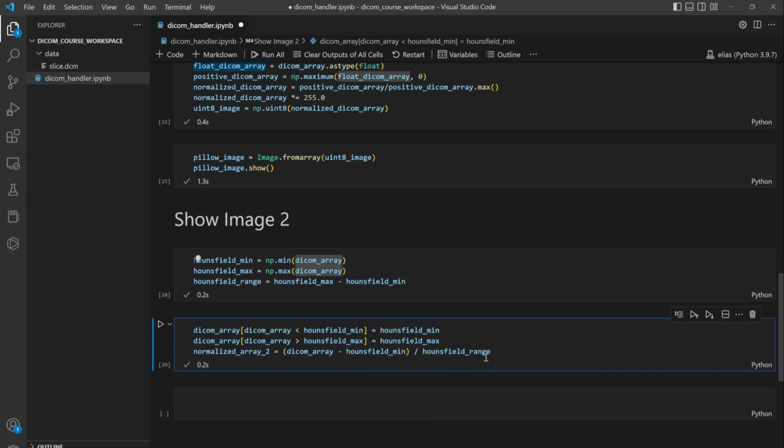So this is almost the same that we did, but only the idea is different. Here we are only taking the image and dividing it by the maximum. But here we are taking the image minus the minimum, which means we are adding the minimum. Then we divide this by the range. It looks similar, but it is not. If you test it, you will see that there is something different here in the values, okay? Especially for the next step that I will show, because until now it is almost the same, but in the next step you will see that there is a difference, okay?